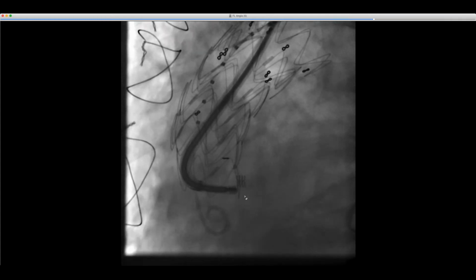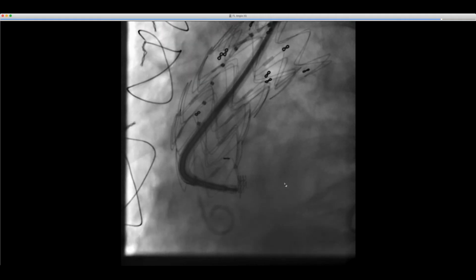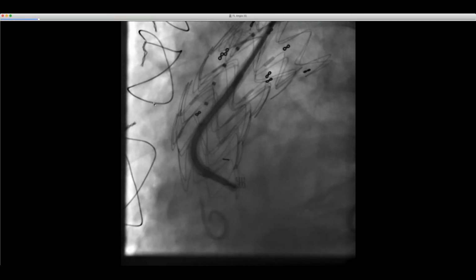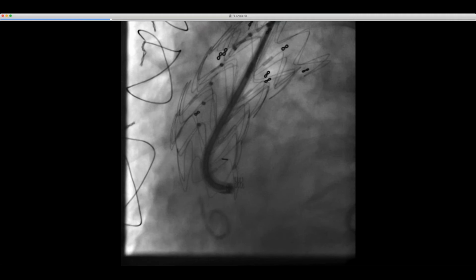But I think it's a fascinating technique, and this actually did dramatically decrease the leak. I think we may still have a tiny leak on the follow-up, but it dramatically decreased the size, and actually they deployed 3 screws, it looks like here. So anyway, I just thought that was a very interesting technique, endo anchor. Those are my 2 cases this week.